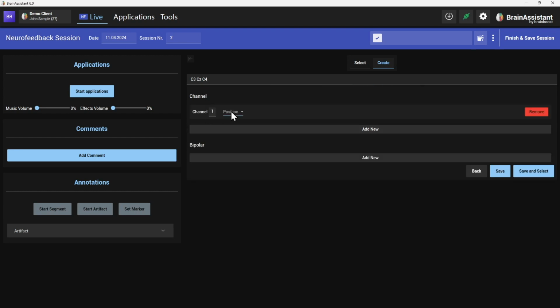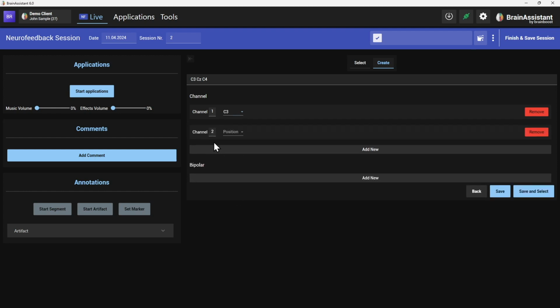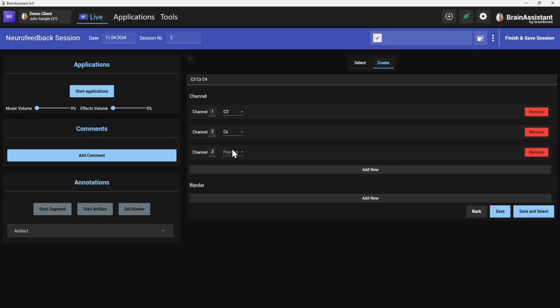And then we say, hey, channel 1, by the way, is position C3. Now, channel 2, I will put on CZ. And now channel 3, I will put on C4. This is now the information I give our software. And obviously you need to be strict, and then in your device, depending on what you use, if you use, I don't know, Neurobit Optima or something, or ANT Neuro with adapter that thinks in channels, now we tell, hey, this will be on C3 channel 1.